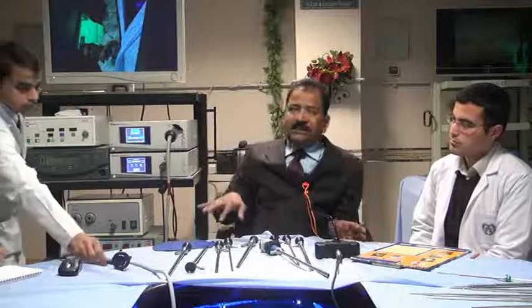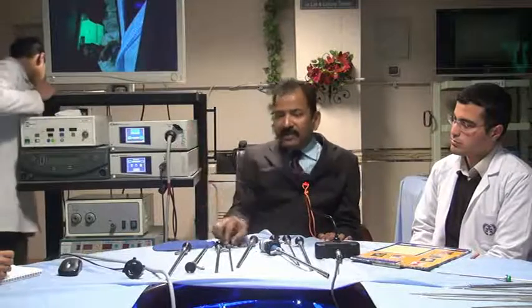So if you bargain a little when buying entire sets, you will say, no, I will give you 1 lakh less. Then they will give you E-class. And from outside you will never know, you are confused. And if you see it alone, everything looks good. You will say, yes, it is fine, give me.